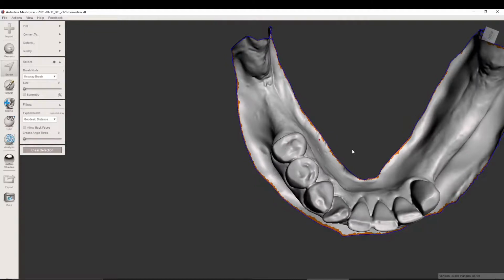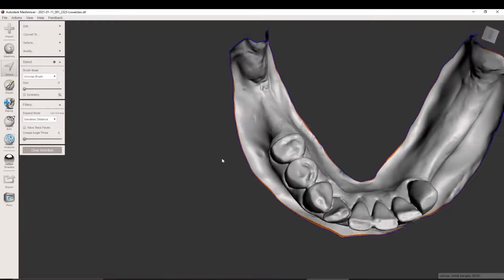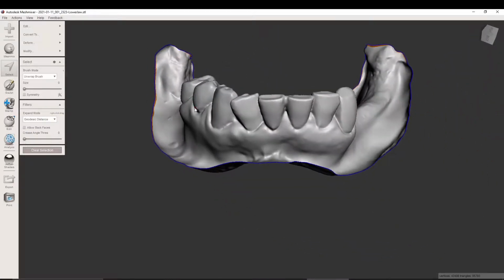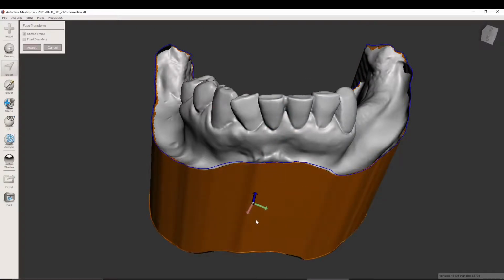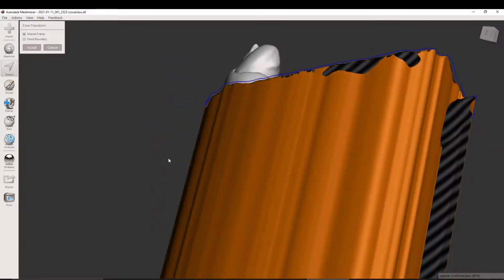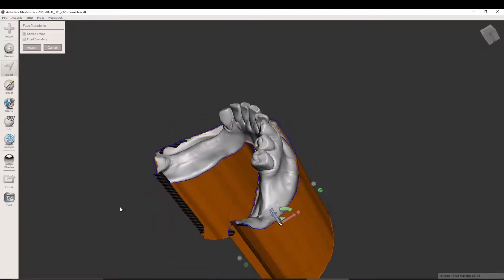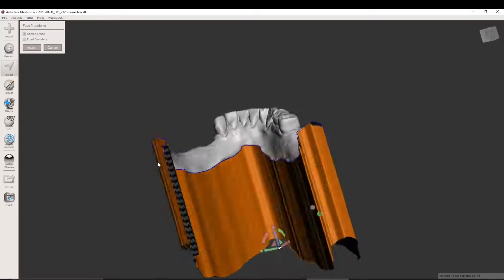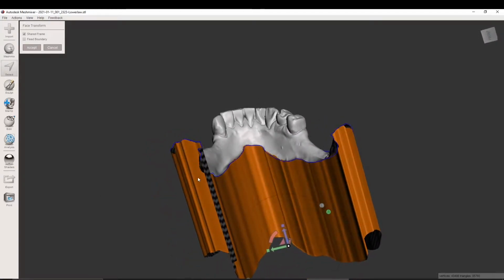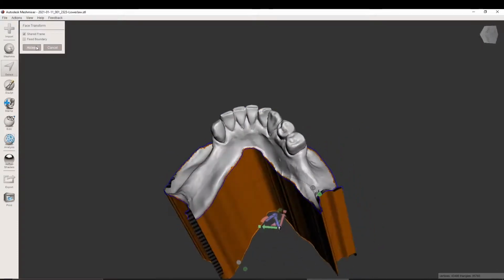Now I'm going to press O for optimize boundary and B for smooth boundary and then press accept. So now I have this area selected. I can press T for transform and choose W for world orientation. So when I drag down this, it's going to be just fine. But you see some areas where I have the undercuts, it's going to cause me some little issues or tears, which are usually not a big deal. I can clean those up fairly easily. And sometimes I don't even need to, but just in case when I have to bring it into 3Shape or something, I'm going to do that anyways. Okay, let's press accept.